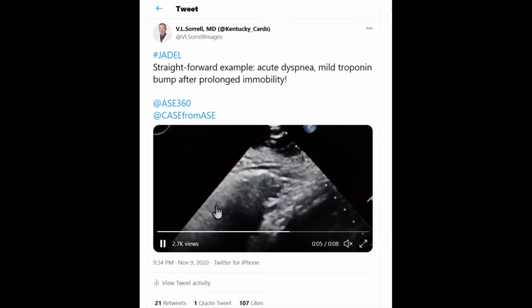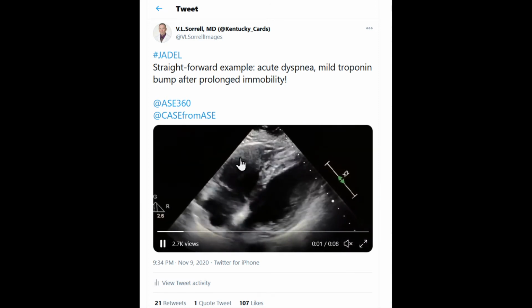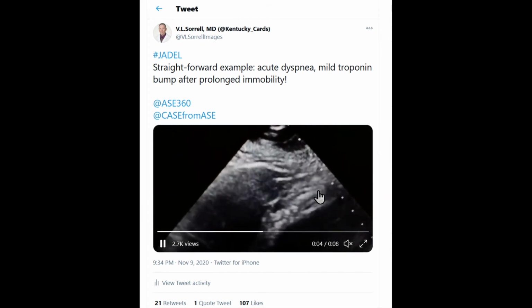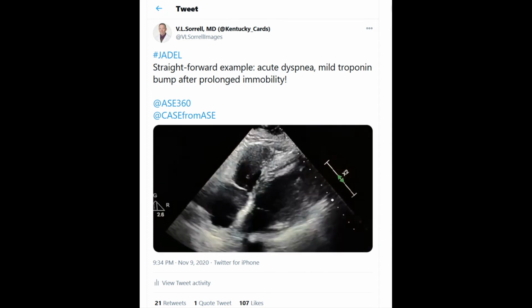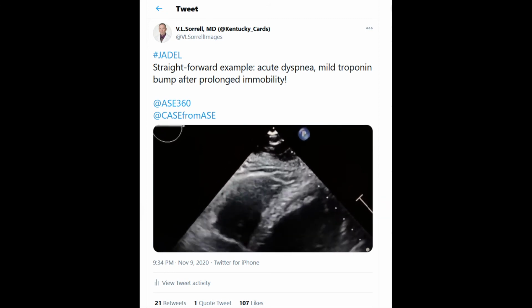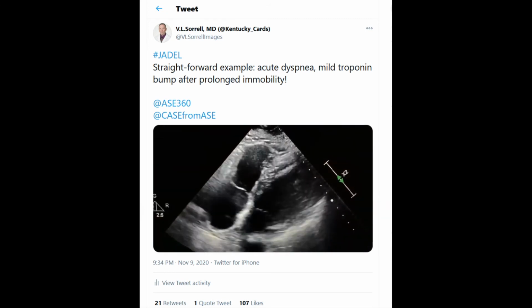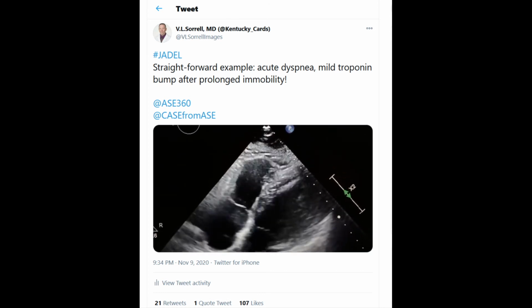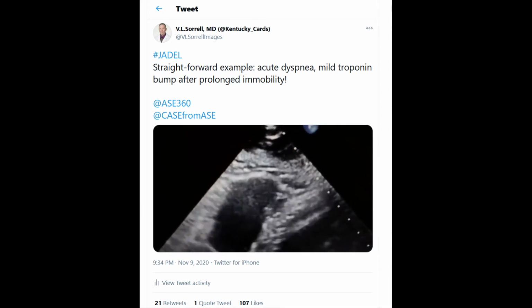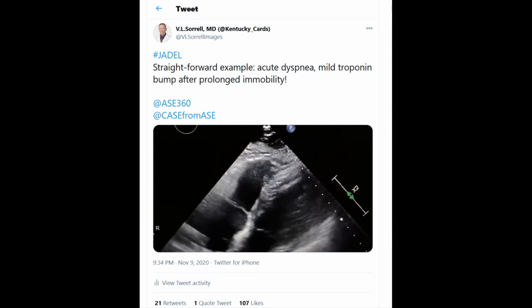And when you have acute pressure overload and hypokinesia of the free wall, probably due to ischemia, you end up with what appears to be hypercontracting tethering of that apical motion. So like I said, that was one of the three explanations. The other two were that there's mid free wall elevated afterload from the pressure overload of the pulmonary vascular resistance from the acute pulmonary emboli. And the third was actual RV segment ischemia, where the RV free wall is ischemic.